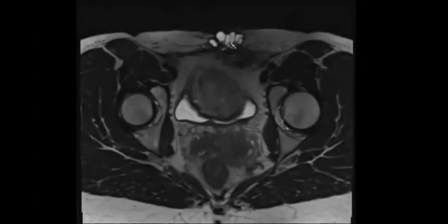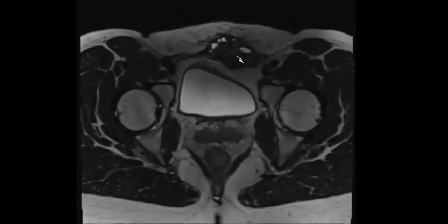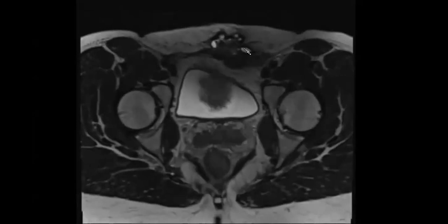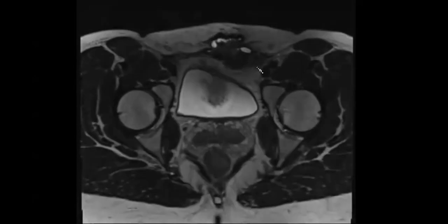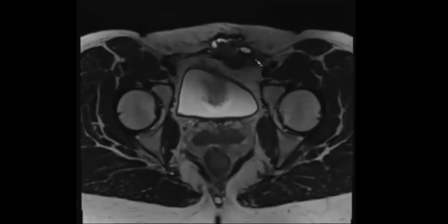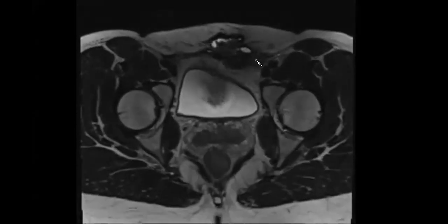Nice. Okay, so tell me why you're saying adenoma malignum, which is a malignant process of the cervix. So we see solid parts, we see cystic parts. What is your differential for an abdominal wall mass in a youngish female? Anyone? I mean, not just endometriosis. Yeah, good. So endometriosis, and then what's the other main thing on your differential? Like young female with an abdominal wall mass.